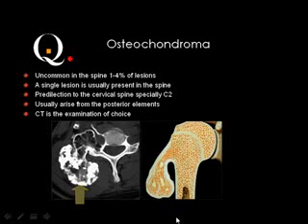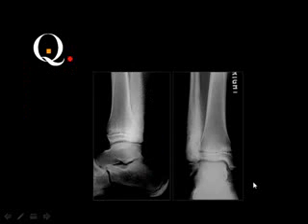Okay. And this is an osteochondroma of the spine. It's very rare in the spine, but this is a beautiful example. And they see an exostosis with a cancellous bone, which is continuous with the medullary cavity. Then what do you think about this?